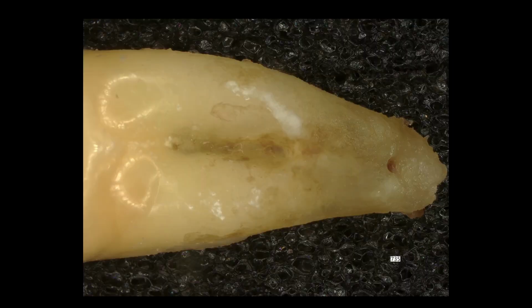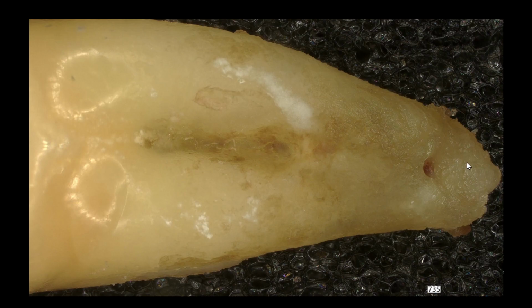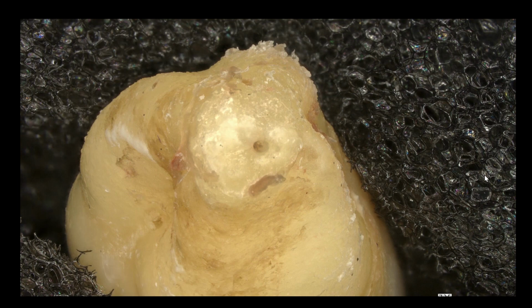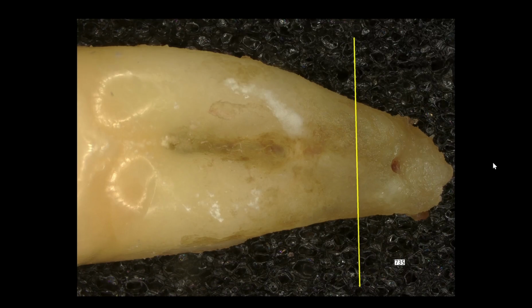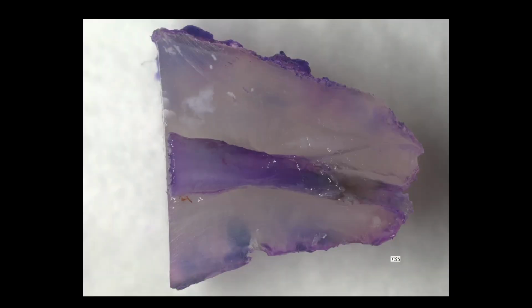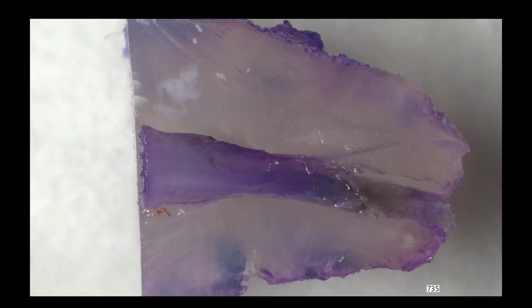It looked like a grossly necrotic tooth. And when I got the tooth, you could see it was a fused root, which presents problems with sectioning. So I decided to section it horizontally and at least take a very good look at the terminus of the root. So I sectioned it horizontally and then split the tooth sagittally, hoping to get a good look at the dentinal surface. This is the wet specimen, sectioned sagittally.